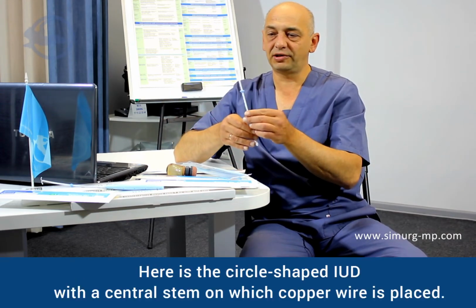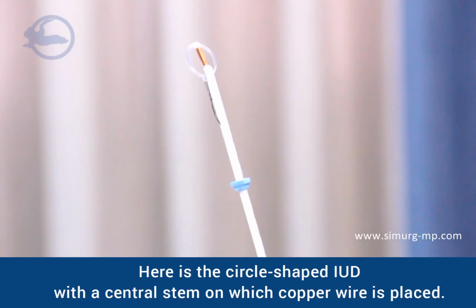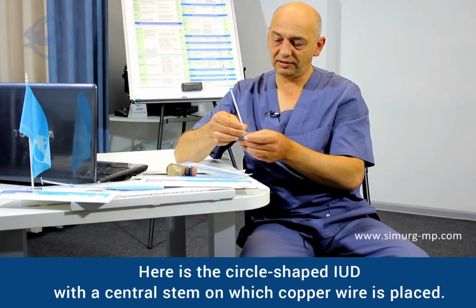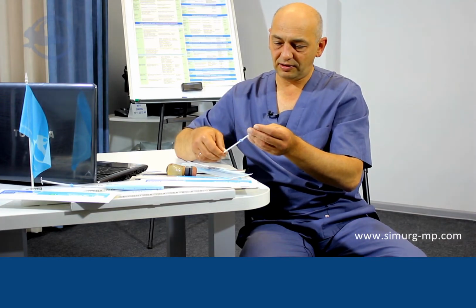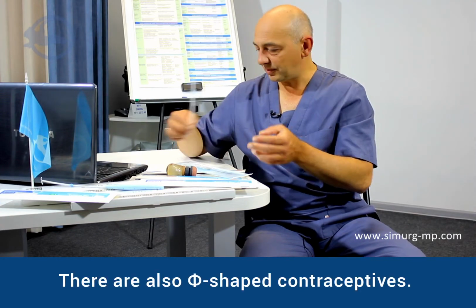Here is the circle-shaped IUD, with a central stem on which copper wire is placed. There are also phi-shaped contraceptives.